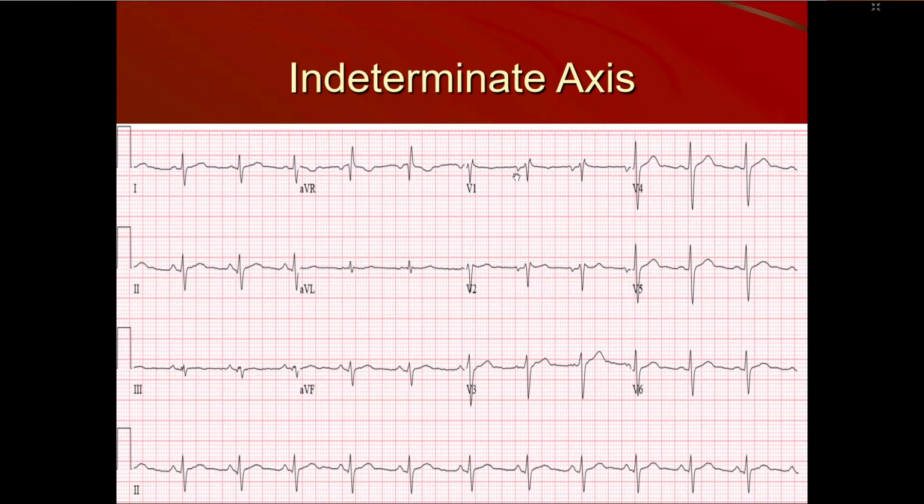And what else is there in this ECG? Rate, rhythm, axis, P waves you have seen. See the QRS. There is an RSR dash pattern with ST depression, T inversion. So this is a right bundle branch block. Now look at the QRS duration. QRS is not more than 3 small squares. So it is an incomplete RBBB. It is not a complete RBBB. Okay. Now what else can you find?